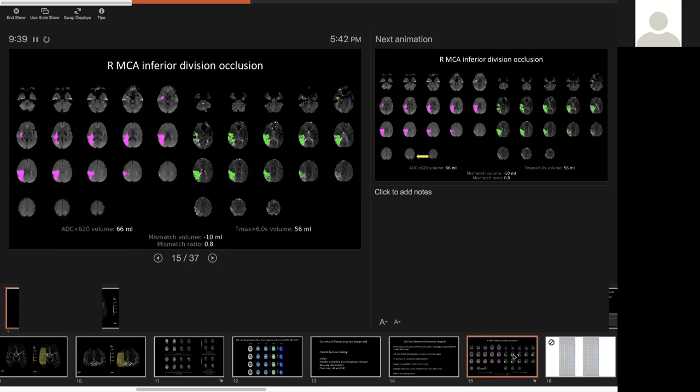It is totally matched. This is dead brain tissue. So I could have taken her straight to the cath lab without doing any imaging, and I would have seen this large M2, and we probably would have opened it. But one of the things that you can see, and we just saw an example of that, is when you have tissue that's dead, and you return blood flow to a large swath of dead brain, you run the risk of hemorrhage. And when you're going after an M2 in general, you run the risk that it's a higher risk vessel to go into.